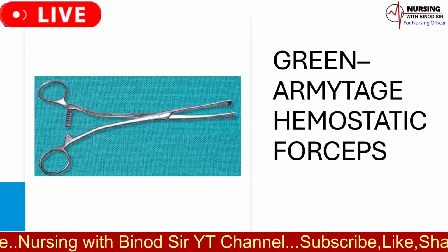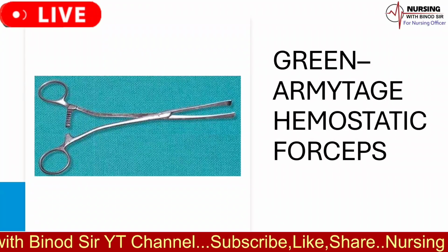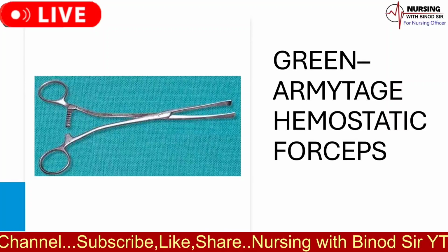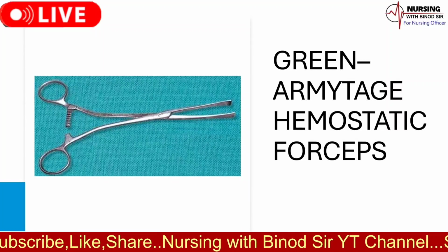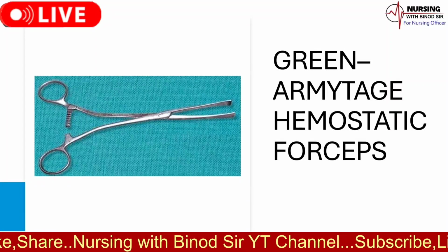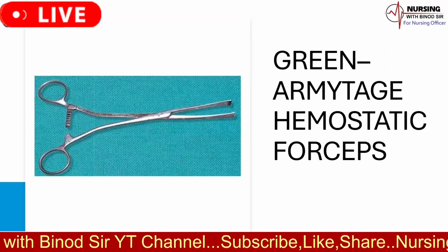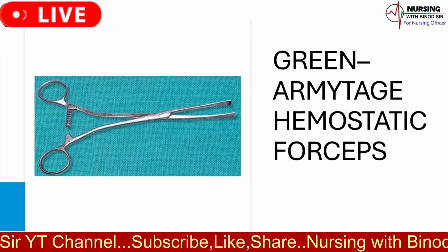The name of the instrument is Green Armitage Hemostatic Forceps. The uses of Green Armitage Hemostatic Forceps is as follows. 1. Maintaining hemostasis. These forceps are used to control bleeding by clamping blood vessels or tissues during surgeries, ensuring a bloodless surgical field. 2. Caesarean sections. They are commonly used in caesarean sections to grasp and hold uterine tissues, assisting in safely delivering the baby.